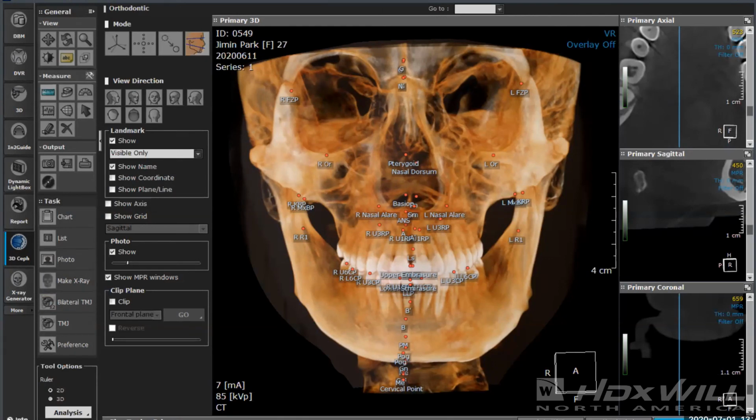I think when you go into 3D analysis, because it's becoming more and more prevalent, and there's more and more literature coming out about it, you're going to find more and more people looking into 3D analysis. Dr. Cho has done probably the most extensive research associated with that. But then you move into where you're going to find people that have studied Ricketts and all those other analyses are now going to have analogous 3D images to work with to get those same points along the way. With that in mind, I think we are through with the 3D Ceph analysis for today.